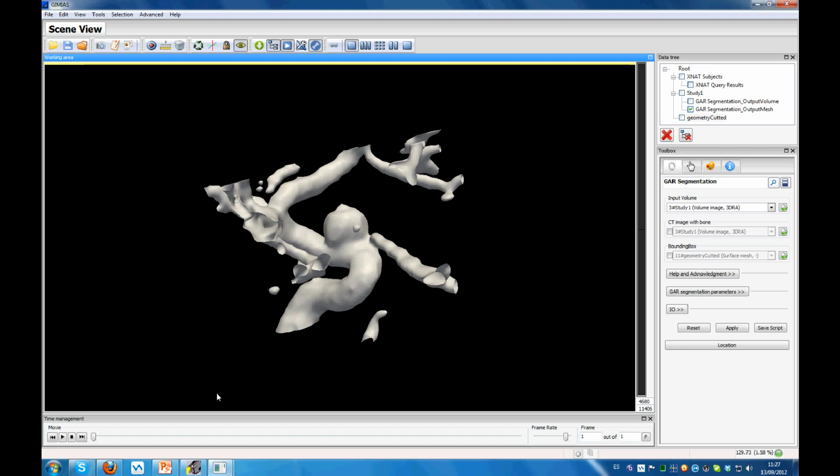We have tested this connection using SSH on the Linux platform, and to configure this execution we need to install GIMIAS on the remote computer and execute it once. Then the configuration is stored in a personal folder of the user, and this SSH plugin will automatically scan all the GIMIAS versions that have been executed on the remote computer, and automatically show what are the available plugins that can be executed on the remote computer.